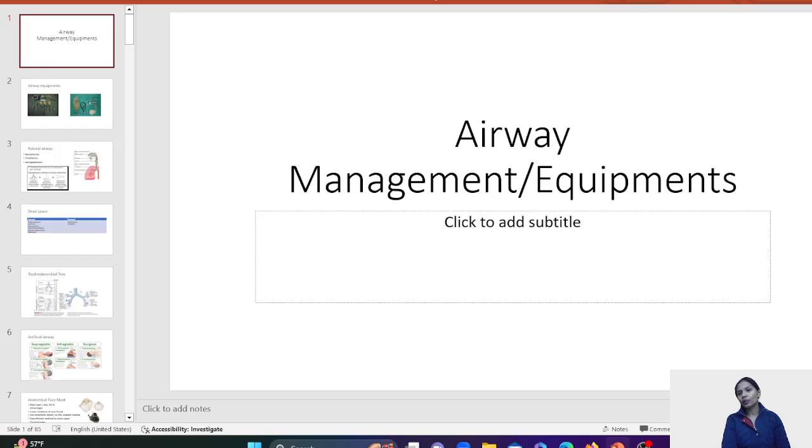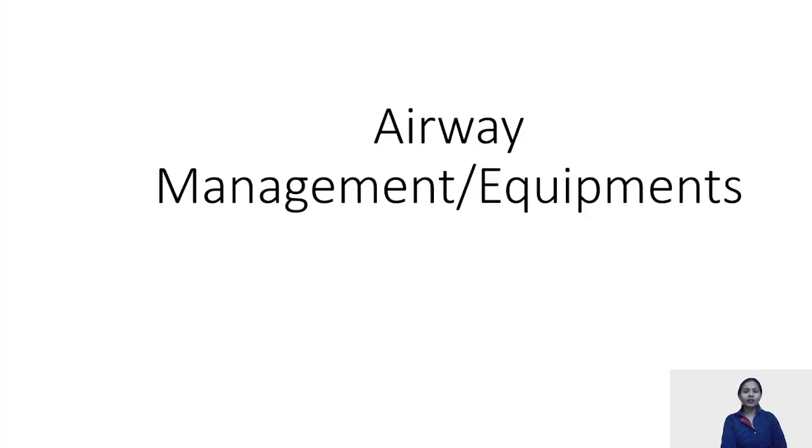The topic that we are going to study today is airway management, or the airway equipment. The importance of this topic lies in the fact that it comprises a lot of image-based questions that have become a trend of the NEET PG exams.